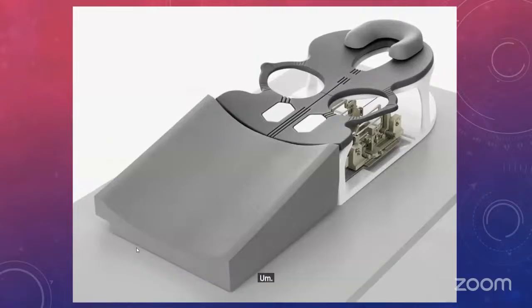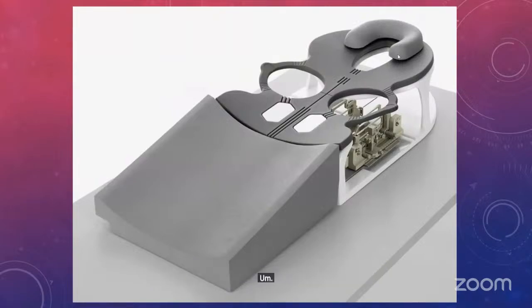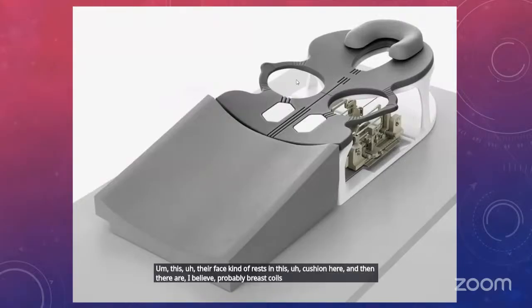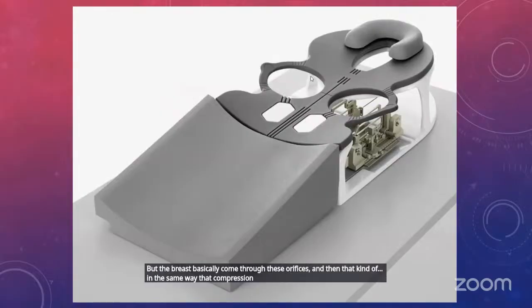This is basically just a picture of a breast coil in case nobody's ever seen it. I think this might actually be a setup that can also be used for biopsy, but basically the patient lies prone on this table. Their face rests in this cushion here, and then there are, I believe, breast coils. The breasts basically come through these orifices, and in the same way that compression helps stretch out the breasts, the prone positioning helps release the fibroglandular tissue.